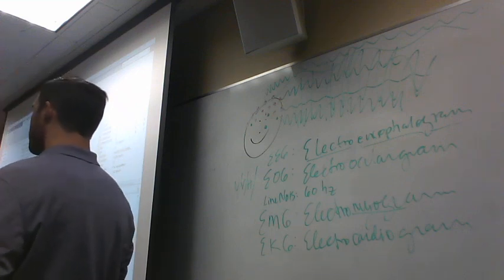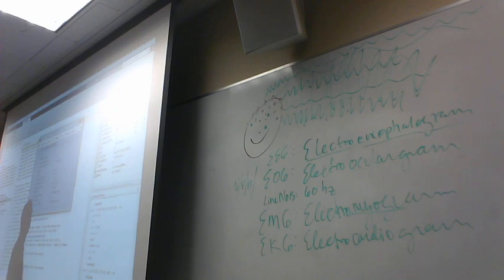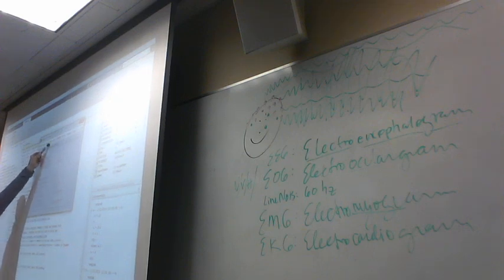Okay? So all the individual ones are like from the EEG config. What do you mean by ones? The signals. Okay. And then the ERP is just what you're saying, that it averages all of them. Yeah, so what the ERP is, so our, which I should say, is our raw EEG trace. So if you go to, you can just do it now. Go to plot, channel data scroll.